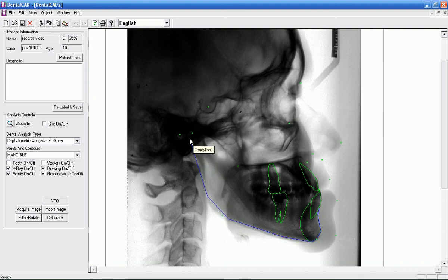And so it shouldn't take you but maybe a minute or so to a couple minutes to do a tracing. Actually, I'll show you something here on this. This will be interesting. Once we get done, I'll show you how to edit when somebody else does your tracing for you, like a staff member.